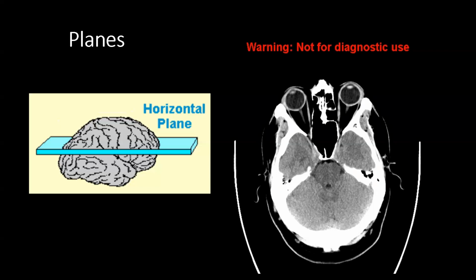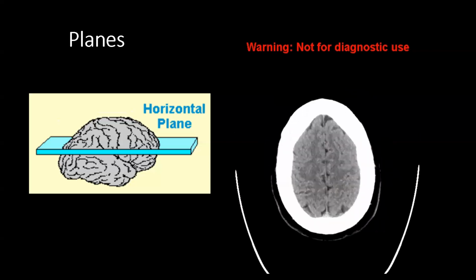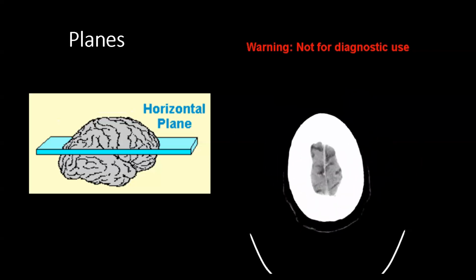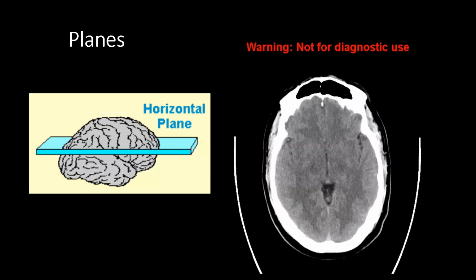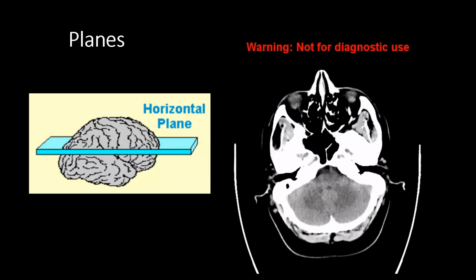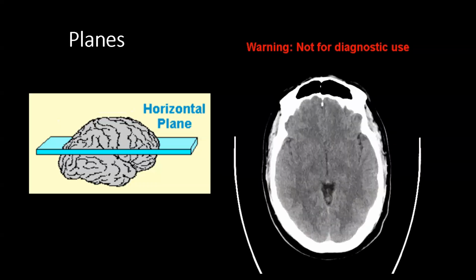That's the orientation. And then as we scroll through the axial images, we can see all the internal structures on our CT. And we'll go from top, moving downwards toward the bottom. And as I scroll through and move throughout today's video, I'll try to tell you which direction I'm going to keep you oriented.